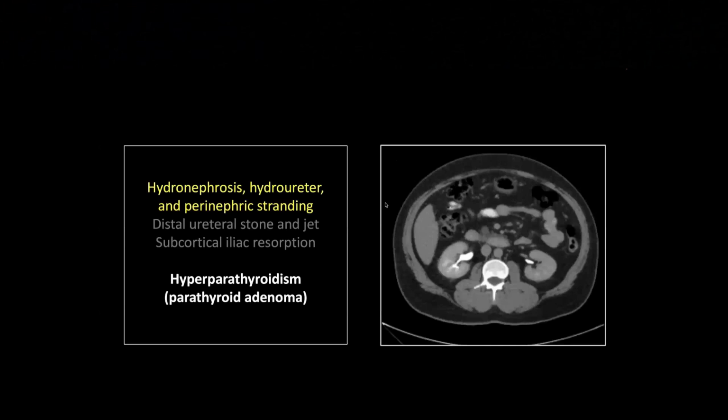All right, this one is one of my favorites. I love the sacroiliac joints. It's the internist in me. When you can spot sacroiliitis, it really hones your differential possibilities, and it can allow you to make a diagnosis that you otherwise wouldn't have.